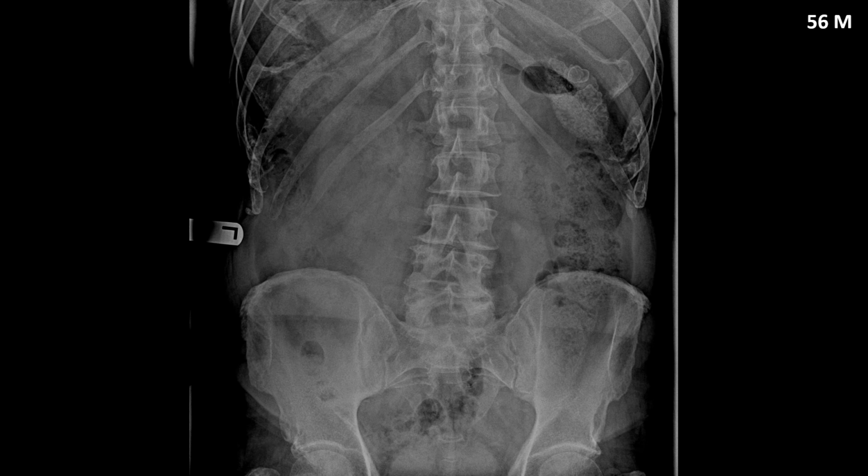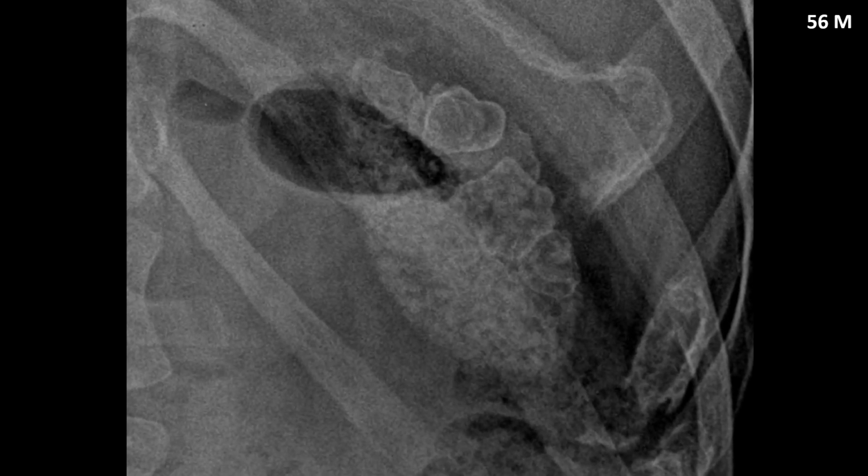A gallstone may appear homogeneously dense, however usually that's if they're smaller and multiple. If it's very dense, be careful it's not a renal lithiasis or a kidney stone. Usually when you zoom in on a gallstone, they'll be peripherally dense with a lucent center. There are so many varying size gallstones in this patient's gallbladder, it's difficult to single out an individual one.